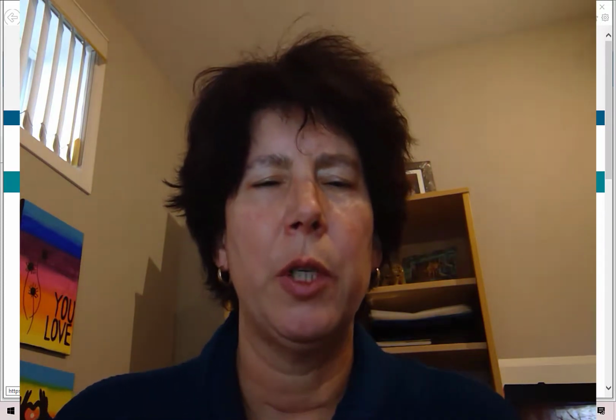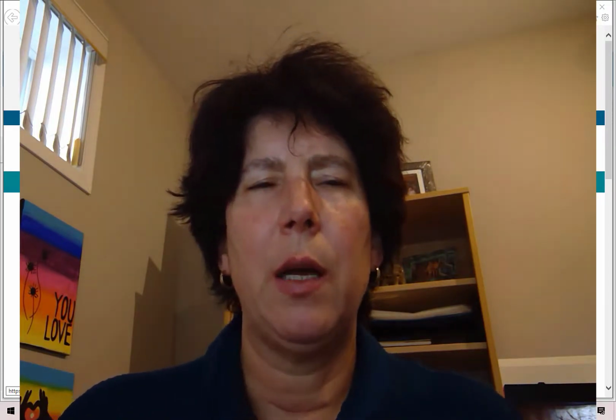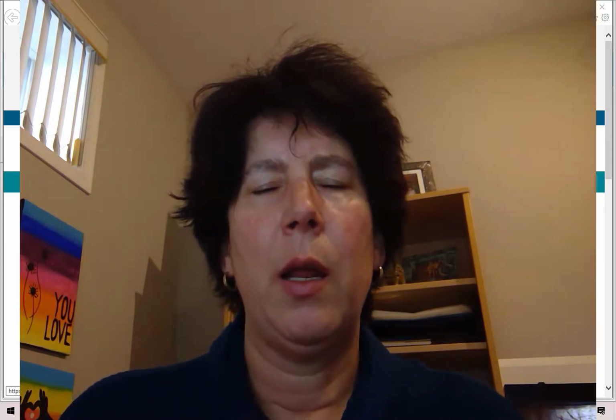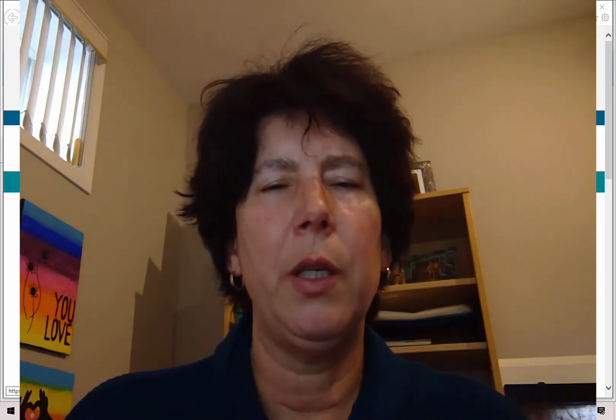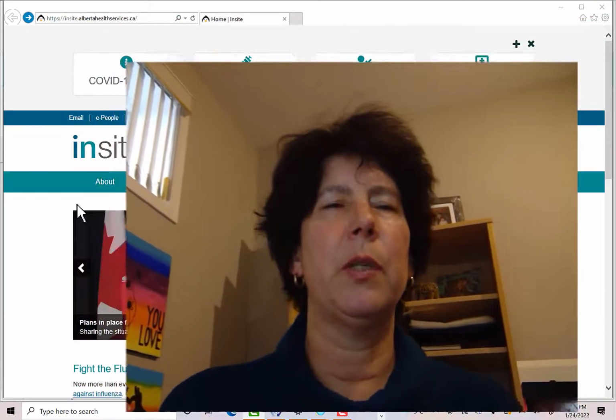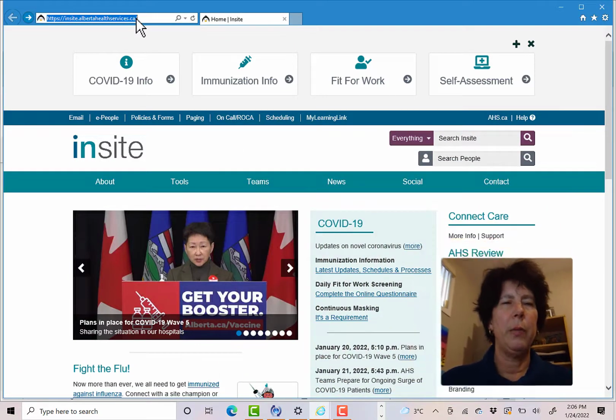Hi guys. Video today is on QPath. This is the archiving software you'll be using when you come onto your POCUS rotation. You are going to use it to store your studies for personal as well as medical legal purposes. You can use the filter or search function to find good studies done by others, and the analytic function to find out how you are doing in terms of numbers of studies. So track your progress.